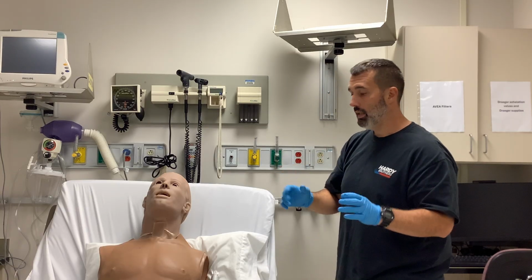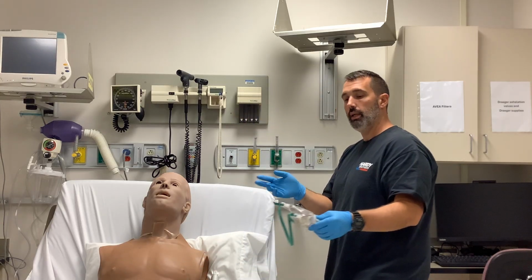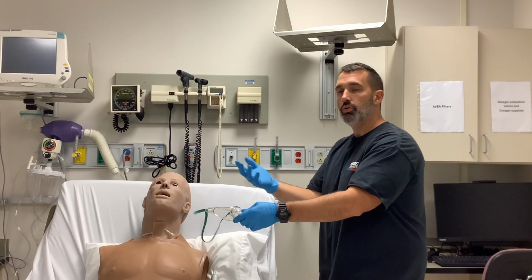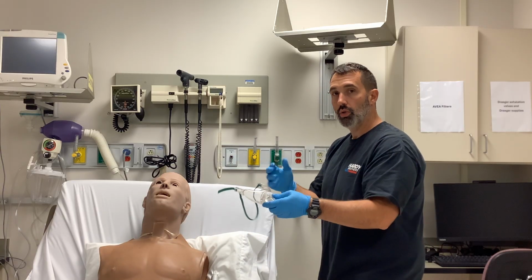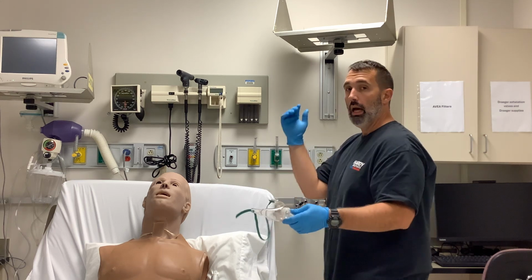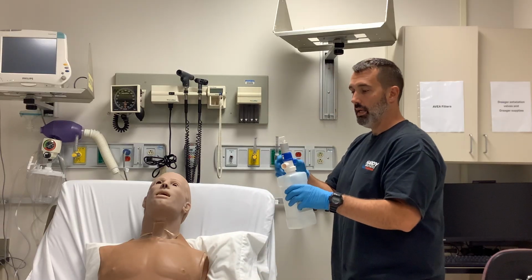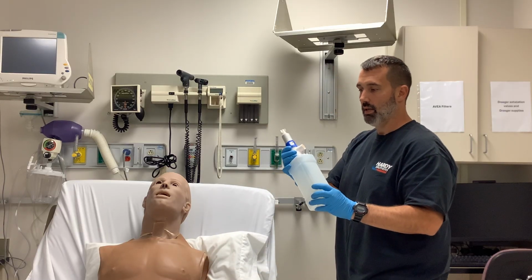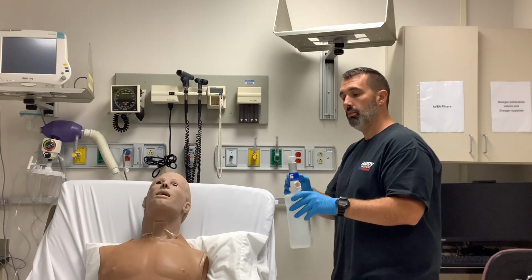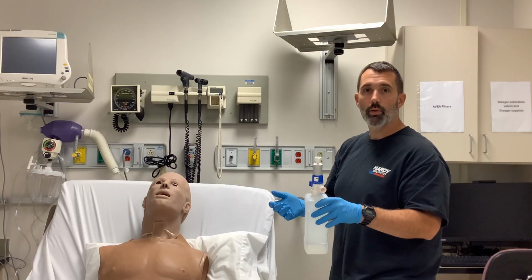That's not going to be, to be right honest, depending upon how deeply or how shallowly they're breathing, that may not even be enough to flush the exhaled CO2 out of the mask. That's the scenario that I encountered with a pediatric patient. I had an air entrainment bottle or a large volume neb that was set up similarly, and it might have been set at say 40%. And I saw a resident come into the room and say he wanted to wean the O2. So he turned the O2 flow down to 1 liter per minute.